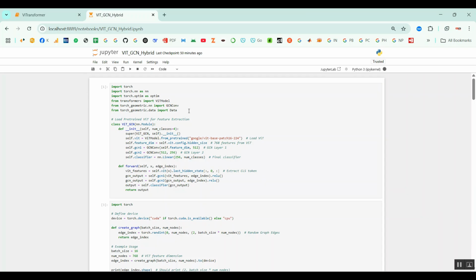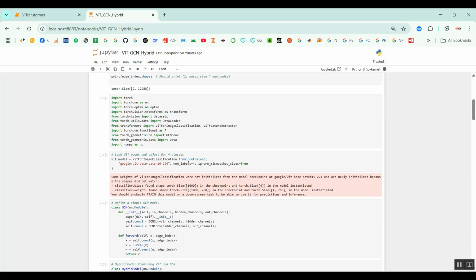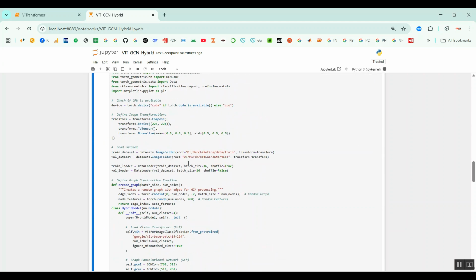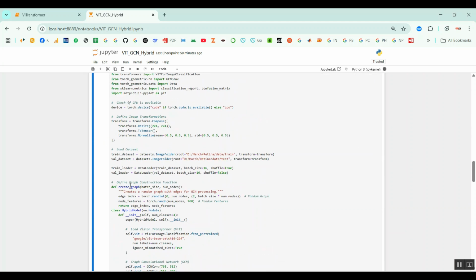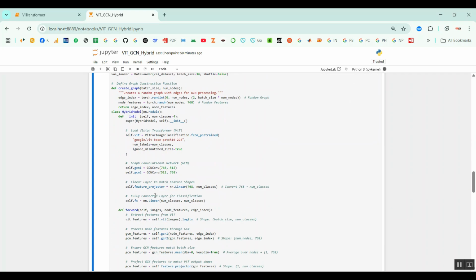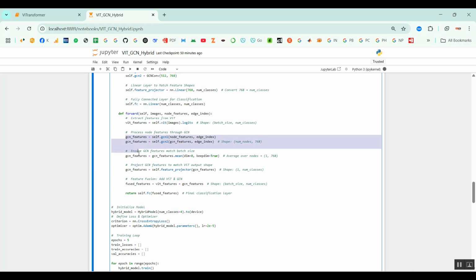So I tried first with ViT, because for ViT itself I didn't get an implementation at that time. So once that is completed, then ViT with GCN, I just updated for you here. So I am doing here with the part of ViT with the GCN part features.